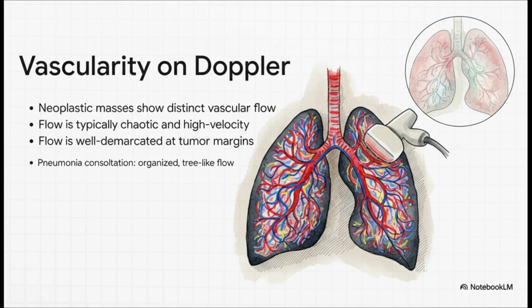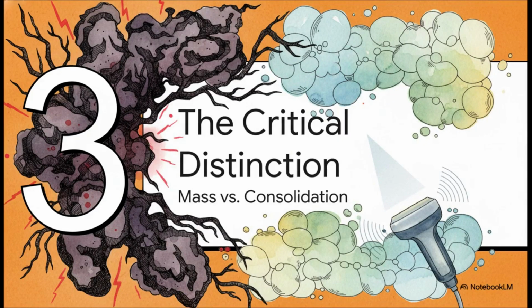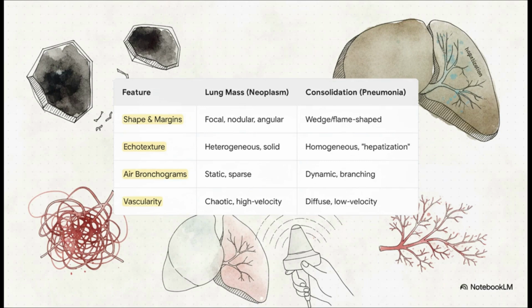So all of this brings us to the main event. This is really the number one reason we're doing this exam at the bedside, to take all those clues and confidently tell the difference between a malignant mass and a benign consolidation. Okay, let's do a quick head-to-head comparison. It really lays it all out.